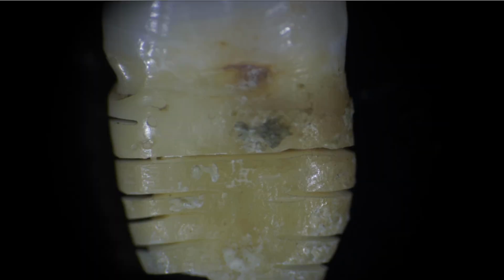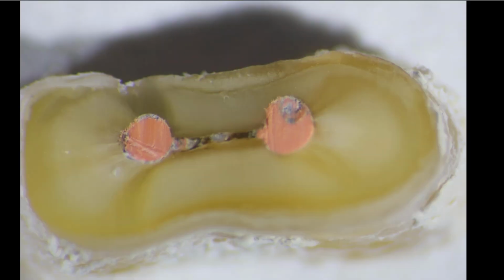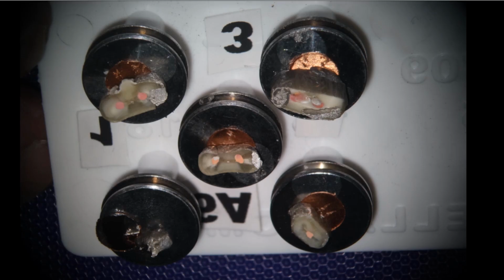Our procedure is that we section the tooth horizontally in about 2 to 3 millimeter segments, and then we examine the horizontal section under the electron microscope. Then we take those sections and split them sagittally. This is what one of the sections looked like. Because it looked to be very well obturated, we're going to focus only on the isthmus area and see if we can detect anything untoward there.